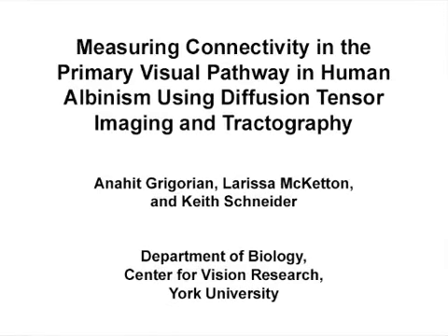The overall goal of this study is to examine thalamocortical connectivity in albinism and controls using diffusion imaging and to compare the output optic radiation reconstruction of two tracking algorithms.